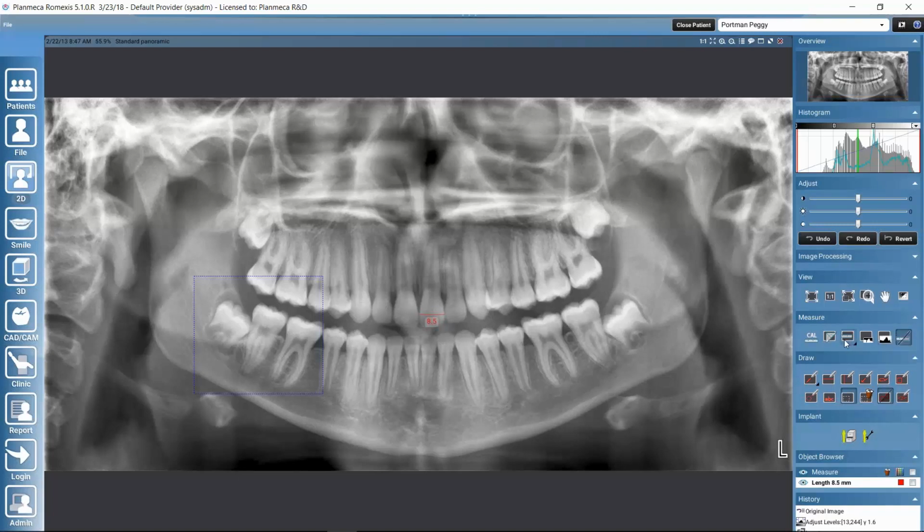measurement available. Well, here with the line profile, we could examine the grayscale values along a line drawn in the image, or then we could see the histogram of some specific area, or then we could hide the measurement labels if they are blocking our view, for example.